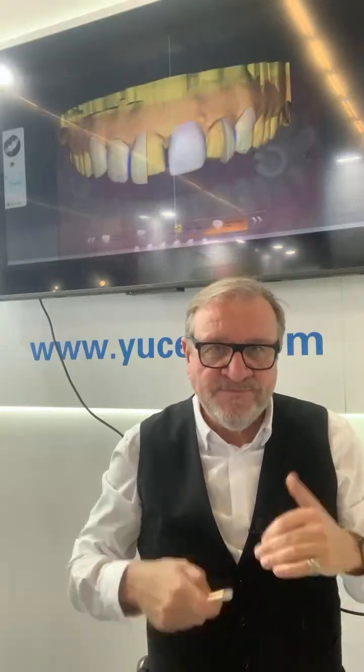We now mix the CAD and make the form inside. See the line, the bites, all that. Sorry. No problem. It's life. Life is life. So we can correct just a little bit. Yes, we can now correct it.